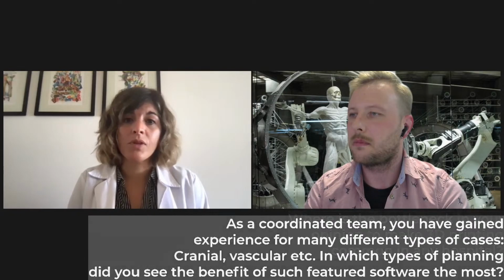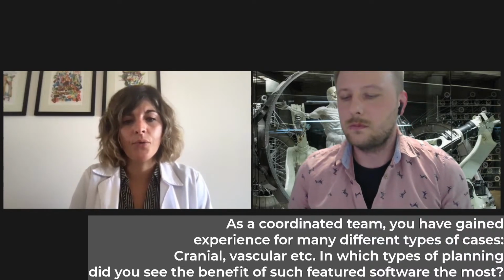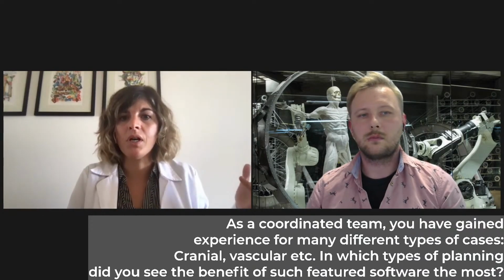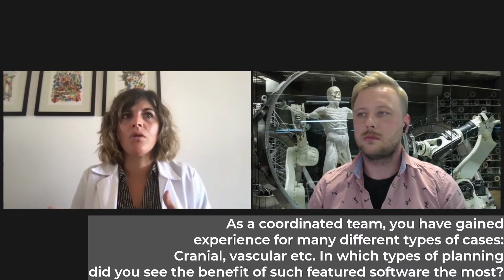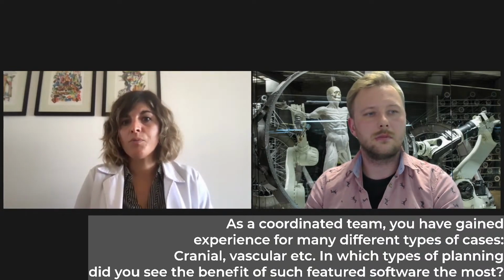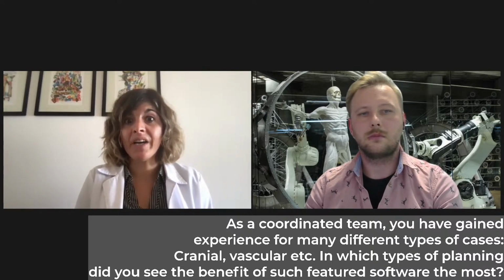The software is great for every kind of image. It's not specialized in any area in particular, because you can create 3D models from CT, MRI, and you can even get information from PET or from any volumetric image that you acquired. So there's no limitation on areas. If you're asking me which area I work in the most, that's probably cases where they need surgical guides.